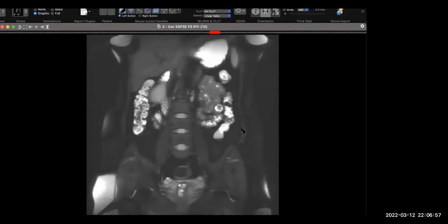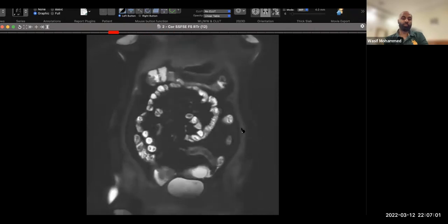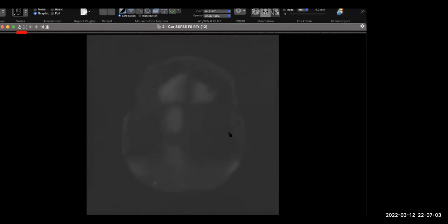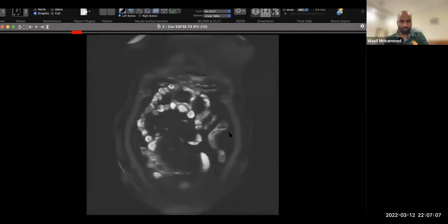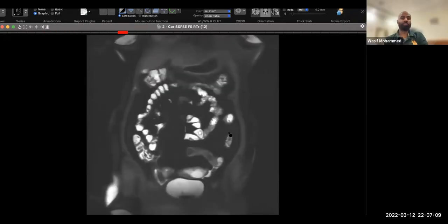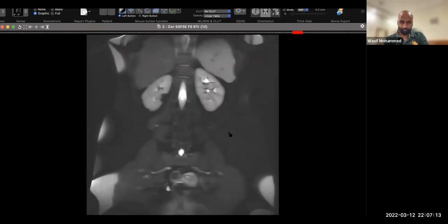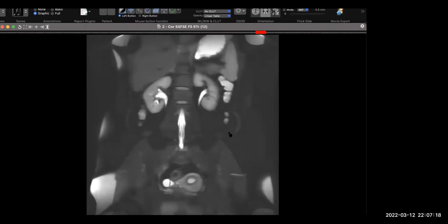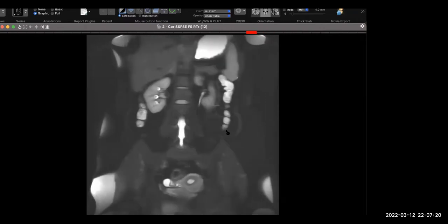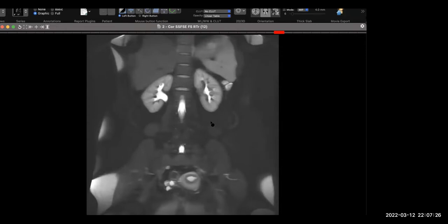Is it a routine MRI abdomen study or is it something more specific? It's a fluid sensitive sequence. Okay, but the study itself, you said it's an MRI abdomen. Is it just a routine MRI abdomen? It's markedly T2 hyperintense. So this is done for a heavily fluid weighted sequence. No, that's fine.